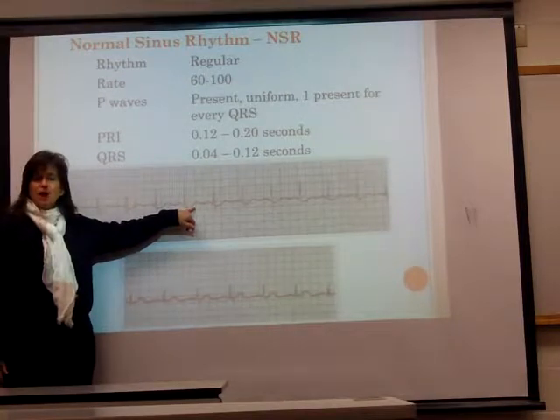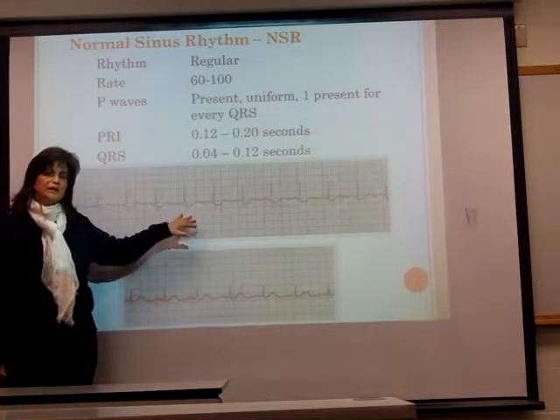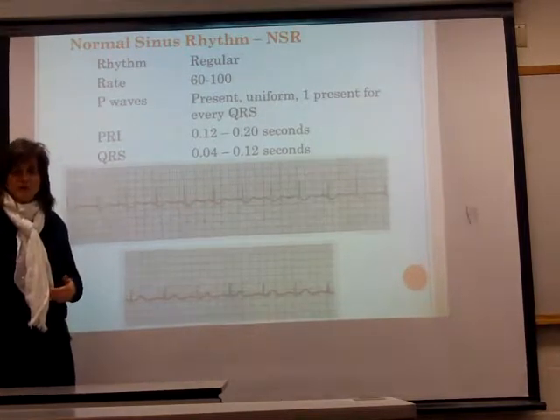With this, the only treatment I would say is, because we have ST segment involvement, then we might show a myocardium that's a bit stressed. So oxygen might be called for. So the treatment here would be O2 and continue to monitor.